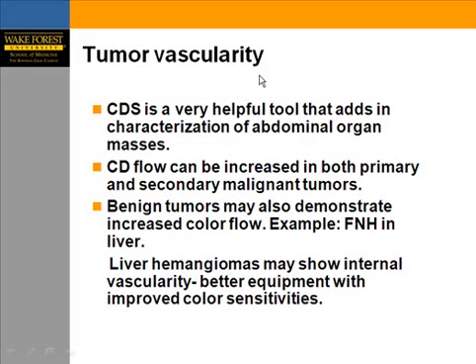Color Doppler also can help us to look at tumor vascularity. It can help us to identify and characterize those. But remember, both malignant and benign tumors can have increased vascularity.